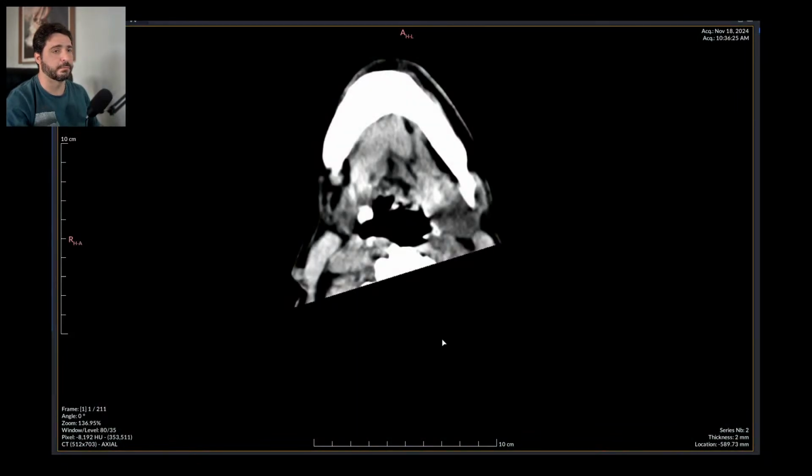It's useful. Usually the referring physician is looking for some sort of dementia related illness, so it's nice to have a coronal hippocampus sequence to rule out Alzheimer's disease.